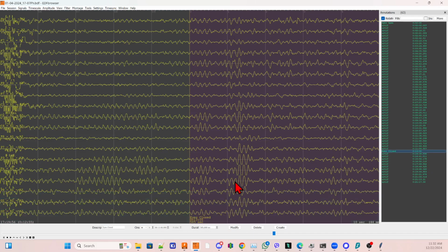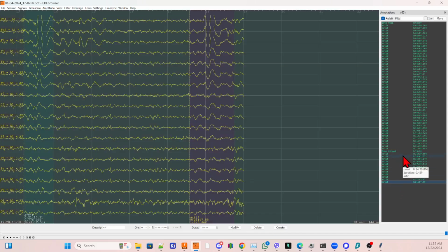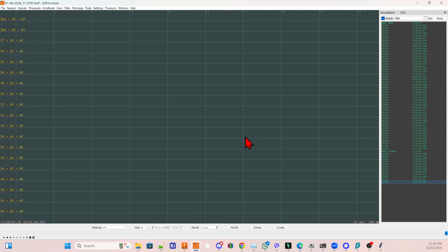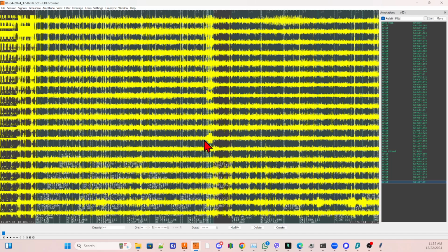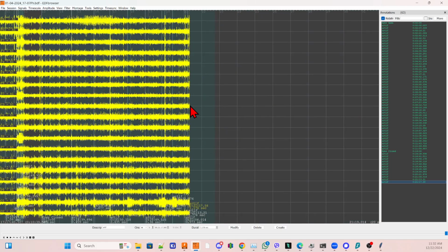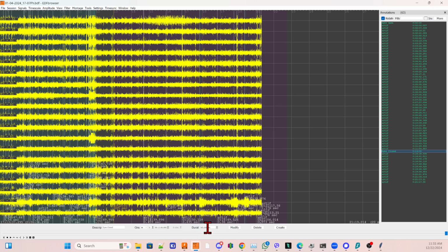I want to make sure that this annotation, eyes closed, actually ends where it's supposed to end, because it is definitely sticking out. If we go to time scale and do whole recording, we can see it's sticking out, and that is not allowed. The computer cannot handle that. So I'm going to adjust the duration here. I had noted in my recording that it went on until a certain time, but we don't have recording until that time. So I'm guessing the recording stopped before I told him to open his eyes.